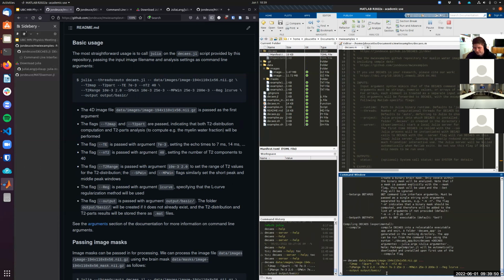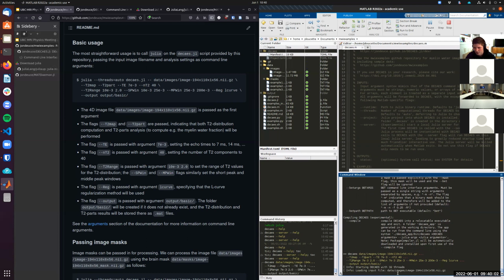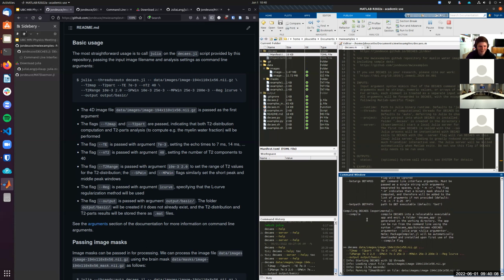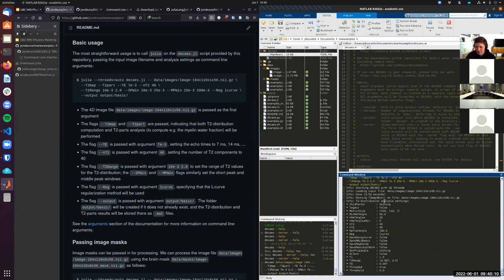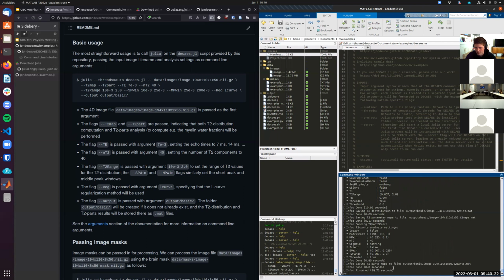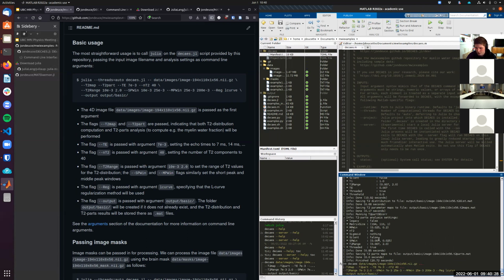Okay, and now we run it. Because I didn't use the server flag, it's starting up Julia in the background, loading decaes, and then calling the entry point function. That'll probably take about 10 seconds. Okay, now it's starting. Hopefully my Zoom doesn't start lagging. Please let me know if it does, because it is compute intensive. Now we've started processing, and this is just a single slice. Julia has to compile things, and all right, now it's done. It took about 20 seconds to do that slice. Let's try again with the server flag, just to see, at least the startup should be faster.